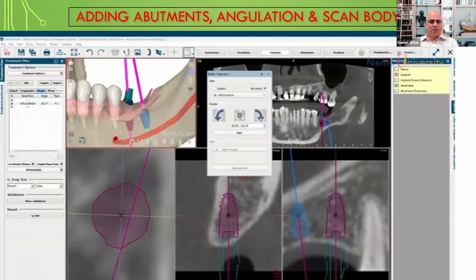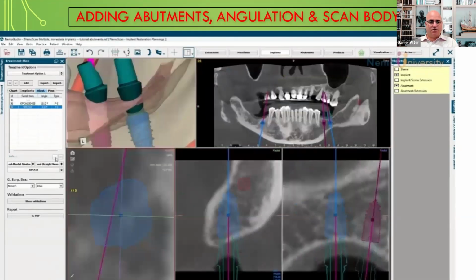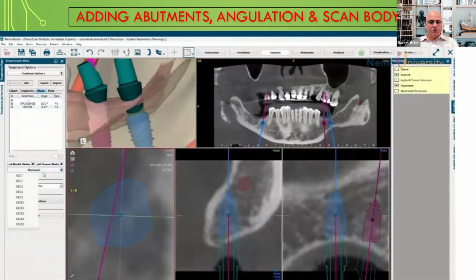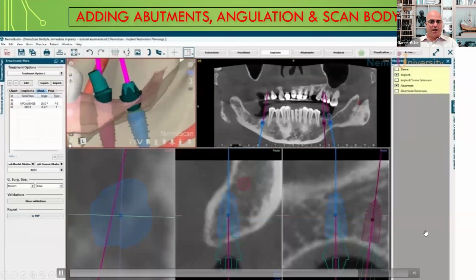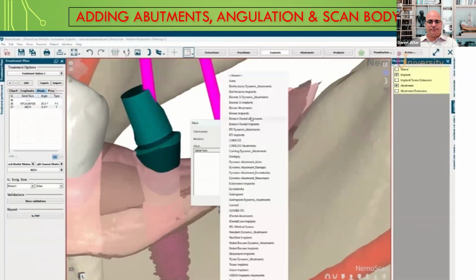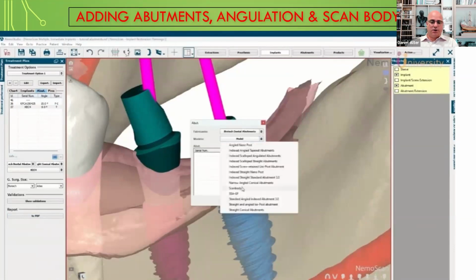So, upon surgery, you can already make these decisions with the surgeon or with the general practitioner or what have you in order to really successfully have the outcome. Again, the benefit of this is you're in the driver's seat. You've already figured out everything before even starting the case, and you can generate something for the clinician that will have it in the patient's box so that they can immediately restore it upon surgery, and even have the definitive, if so you choose, ready for them once they're ready to restore. Once it's osseointegrated and it's ready to be placed into occlusion, you can have all that.